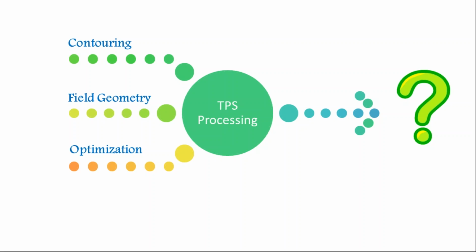Because if I understand this, I will have a clear idea in my mind how much I can push the organ at risk to spare it as much as possible. If I don't understand how close they are to the target, I may put in optimization objectives that do not make any sense, and I cannot achieve a good plan because I put in numbers that make no sense.